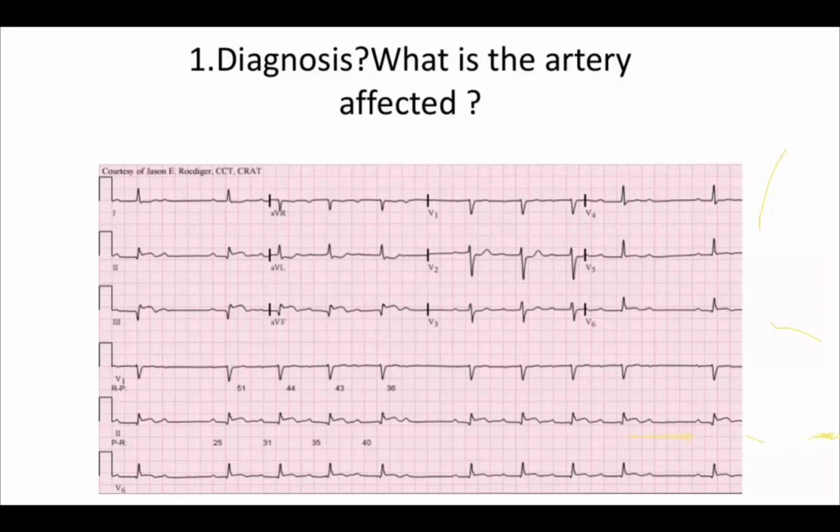So remember, if the low blood pressure is due to LV infarction, usually we have to use inotropes. And if we give fluid, the patient will end up in pulmonary edema. But if it is an RV infarction, the modality of treatment is giving fluids, right? So remember, you can get any ischemia ECG and you must not miss it, because you will be the people guarding the door to needle time.